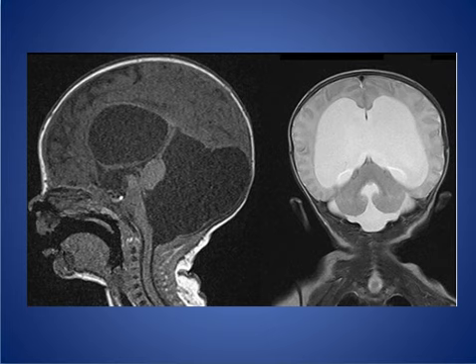The next case, a 19-day-old child with a large head. As we see here, the posterior fossa is large with a large cyst in it. And this is a classic example of Dandy-Walker malformation associated with hydrocephalus.